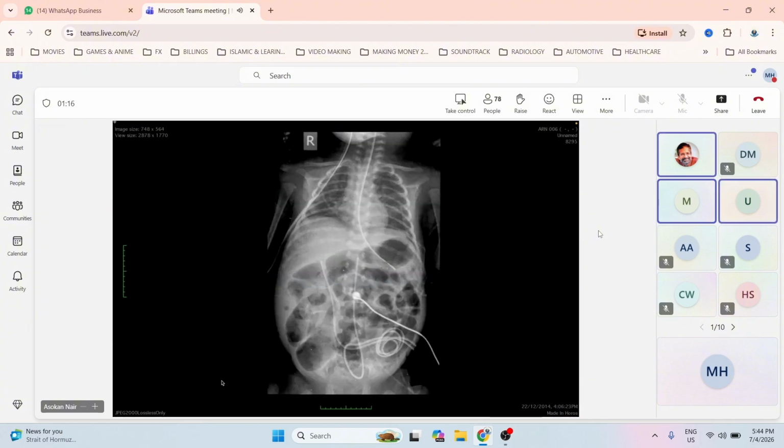Okay, next. Okay, hi Dato. Raja Azmi from UIA. So I would like to try. This is a chest abdominal radiograph in a neonatal patient. The most striking here is the malposition of the UVC, in which it's located within the portal vein. I would expect the UVC tip will be in the inferior vena cava.